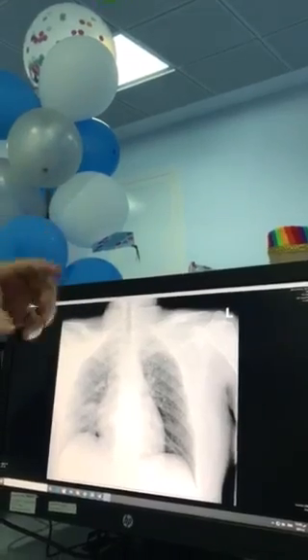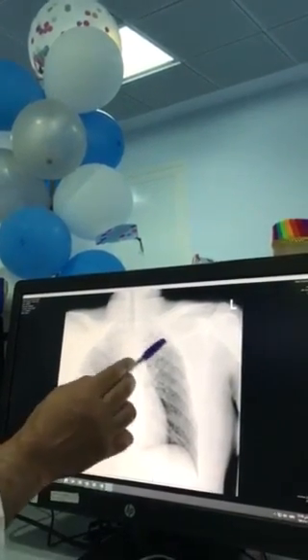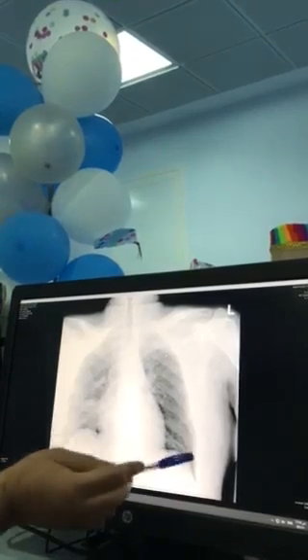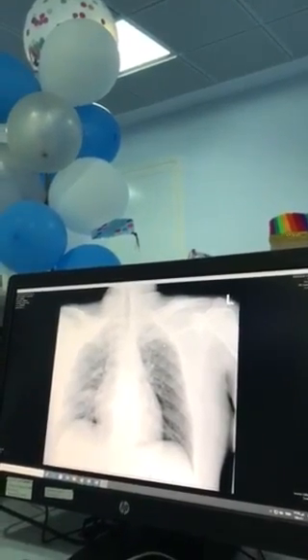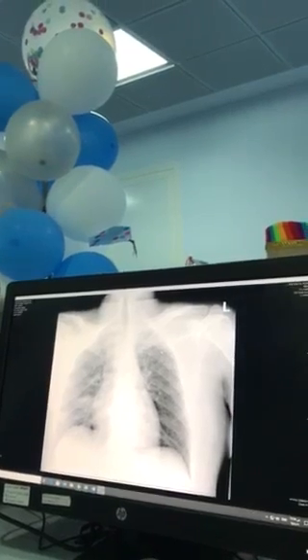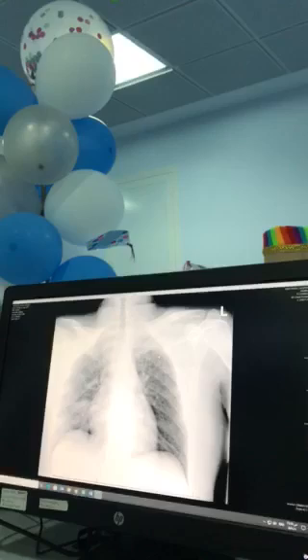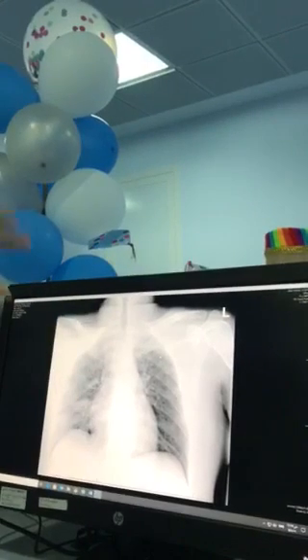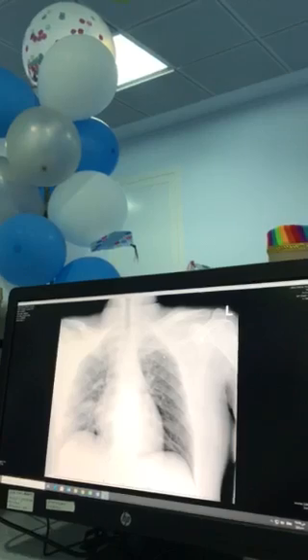More air inside the lung. So you will see more black area, mainly in the apex here and in the border, lighter border here and here. You will see more black material coming out. So if you see more black, that means either the patient is having pneumothorax, or there is more exposure of the lights, or maybe the patient has emphysema.